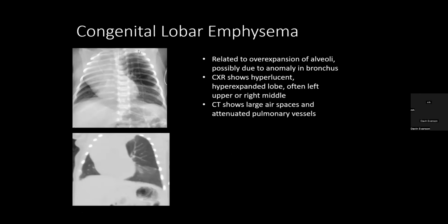One of my favorite things, congenital lobar emphysema. I did a report on this as a med student. I thought emphysema was only an adult diagnosis, but this is something we will see in the left upper lobe, right middle lobe, again, a congenital thing where you get hyperexpansion of one of those segments, here in the left upper lobe. And look what it's doing to the heart. That's part of our checklist. Airway, heart, mediastinum, it's all shifted the other way.